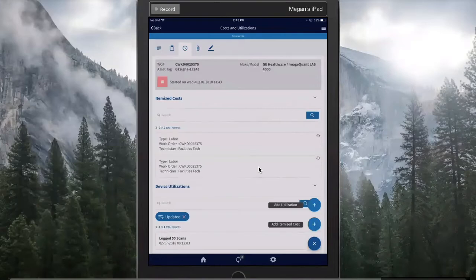And then, when we do add a part to a work order and we're selecting which stock room it came from, we can also have rules running in the background to say we always want this many parts of this type in this stock room. So when we set a replenish threshold like that, when we add parts to a work order and we dip below that threshold, we can automatically kick off a purchase order request to get more parts into that facility. So we never run out of parts. And then we also mitigate the issue of not being able to complete a work order simply because we're waiting on parts.